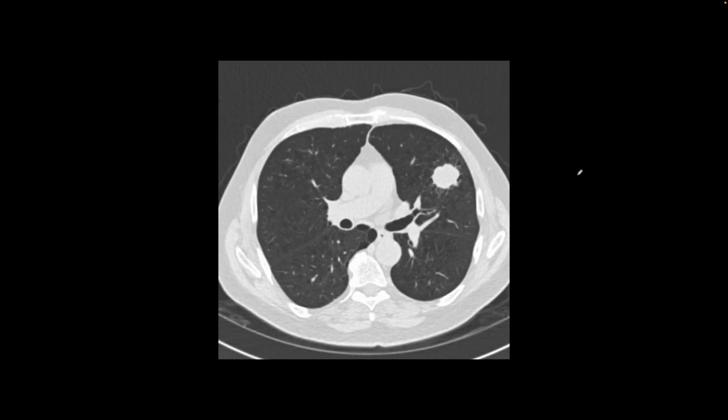This is this patient's CT, which shows the tumor in the left upper lobe. Also, it shows emphysematous changes in both lung fields from smoking.